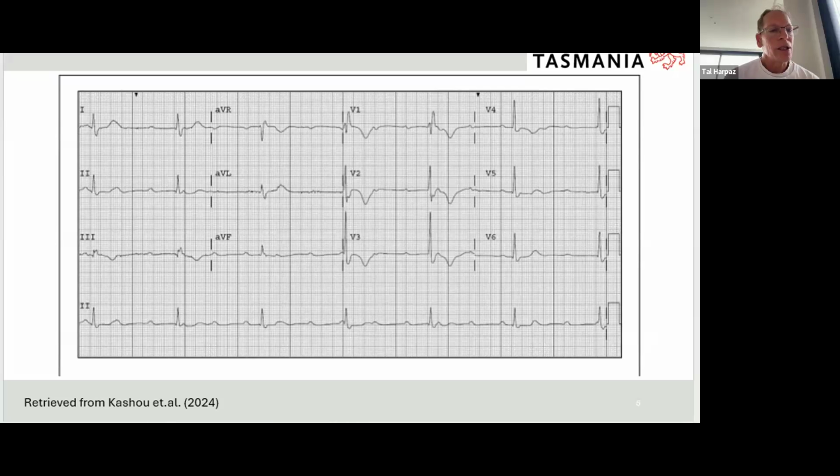Sorry, if I could just ask you a question, Georgie. Sometimes on the ECG we don't have that bottom lead 2 going all the way across. So how do you work out what is 6 seconds then? It's a good question. Ideally you'll have the lead 2 at the bottom, and for your quiz, we'll make sure that we have ECGs there that have lead 2 at the bottom. And your quiz would be just interpretation of lead 2 as well.